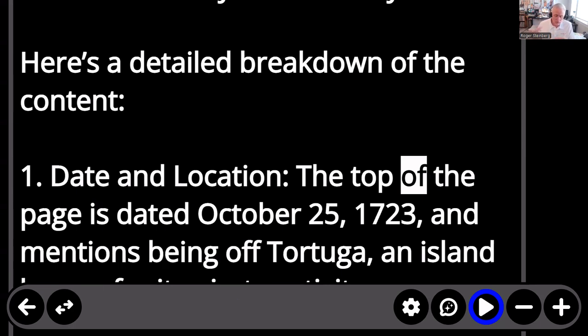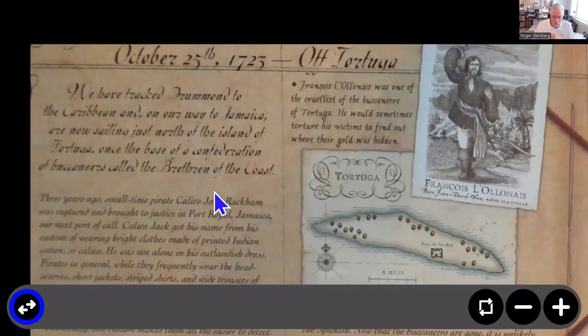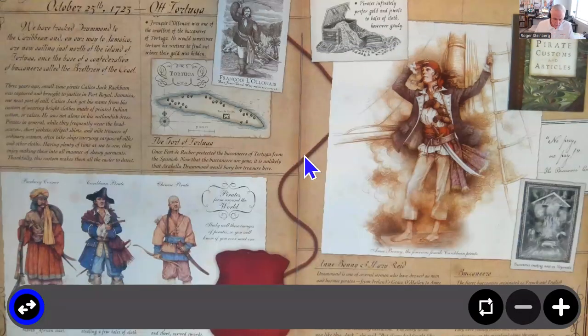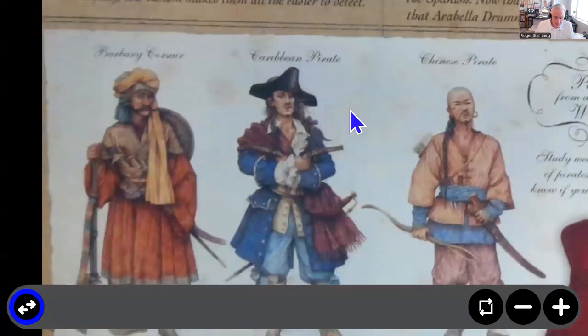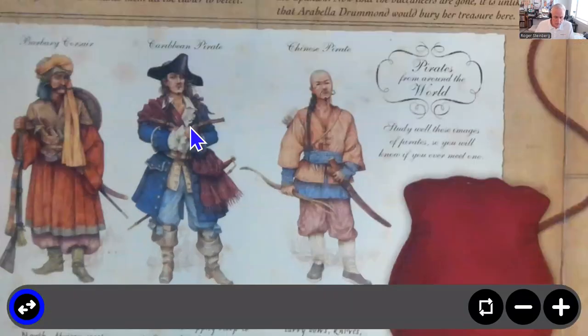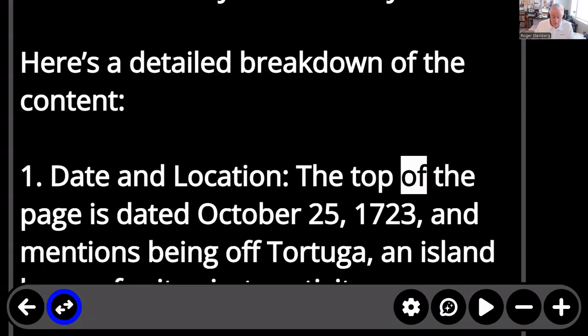In the bottom left, there's a double-sided arrow that points to the left and to the right. If I tap that, what I can see is the image that was captured by the magnifier and sent to our cloud services. So I can zoom in and zoom out onto this. And maybe I see down here in the lower left by zooming in and zooming out, I can then hit that double-sided arrow to go back to my AI assistant and ask another question.